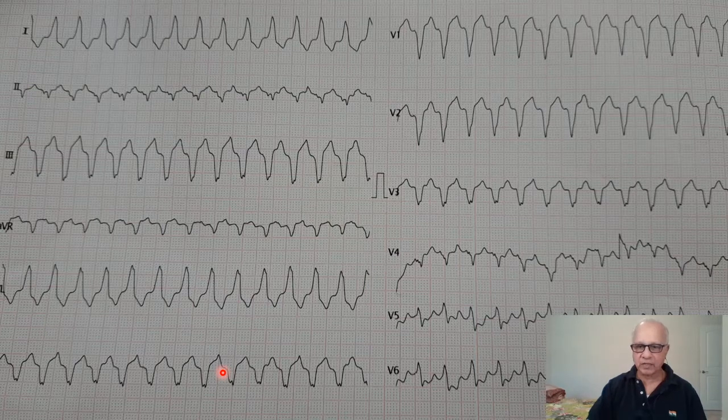Simple. Only one question. Now, if you tell me the diagnosis, you will have to substantiate the diagnosis with specific points. Now, here I want to give you one clue. Don't look at 1 or 2 leads and make a diagnosis. Look at all the 12 leads in this ECG, because there are certain findings in certain leads which will give you clues, which you may miss if you don't look at all the leads. So you can start off answering this. I'll give you 3 minutes for this also, because I know it's a little difficult one and there are multiple findings to be picked up.